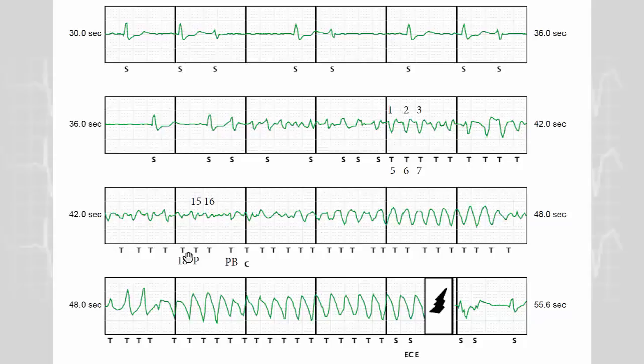We will see in other tracings that this counter is automatically adjusted to compensate for double counting and/or noise detection. This counter is seeded with a value of 4 upon initial transition to tachy mode to compensate for the 4 RR average. It means that when you see the first T marker, the counter is already at 5.